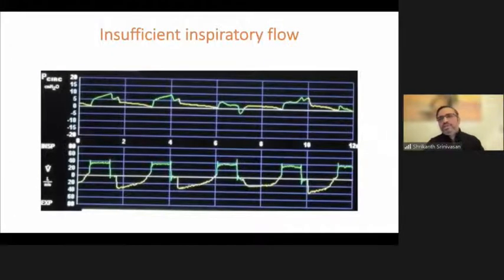Now coming to the flow asynchronies. We finished the triggering asynchronies. We come to flow asynchronies. Flow asynchrony is inadequate flow or insufficient flow for what the patient requires.